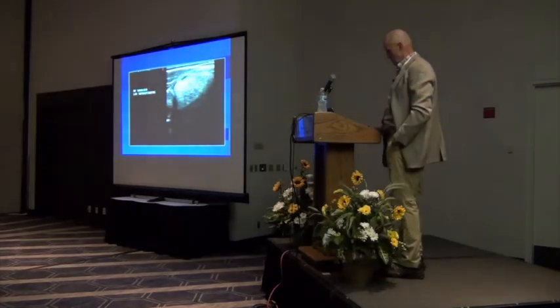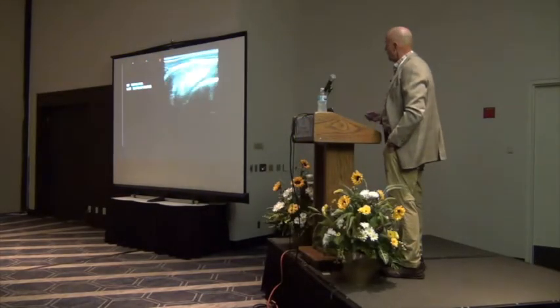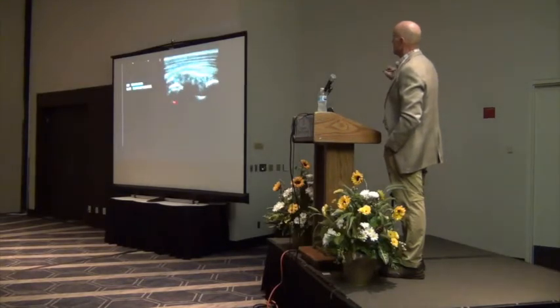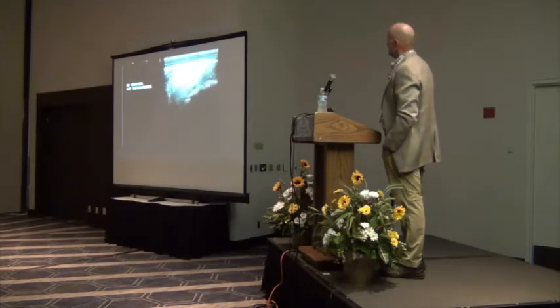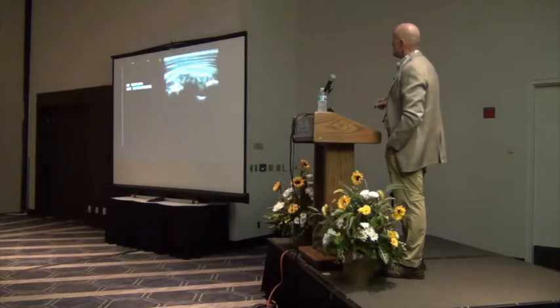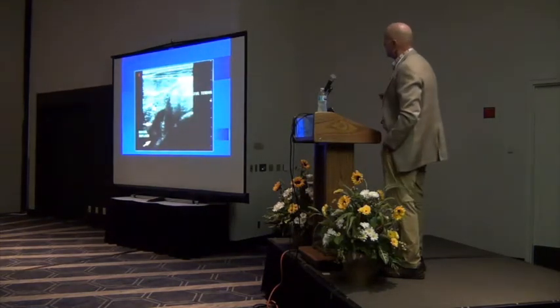And then this is an infraspinatus that has a lot of bursal fluid and irregular bone underneath it as it crosses over that caudal eminence. And then it gets down to the attachment, and there's a lot of irregularity there. Trilobed, bursal fluid, irregular bone, and there's this attachment. So not septic. And then this one was.